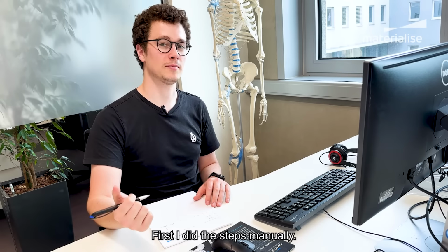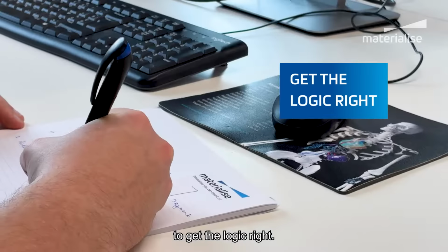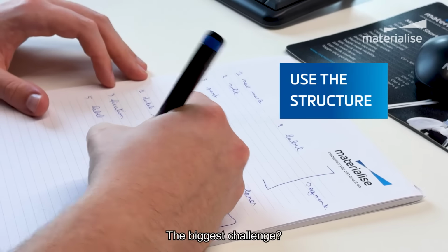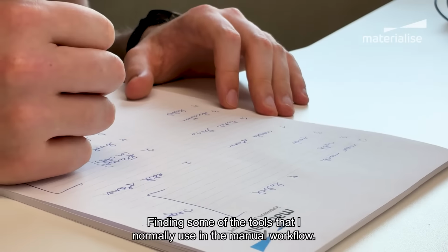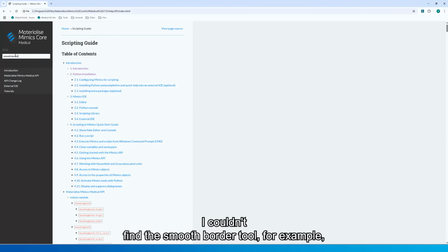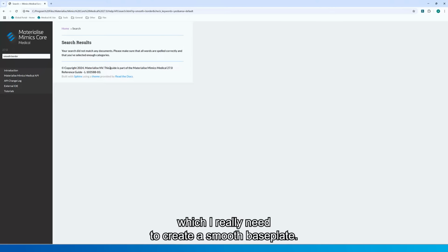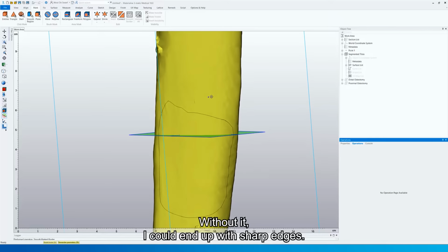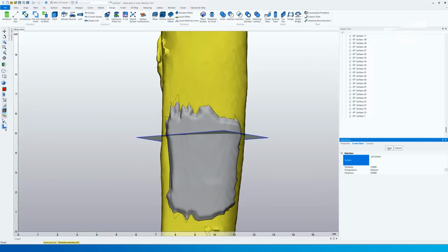First, I did the steps manually, to get the logic right. Then, I used those steps as a structure for my script. The biggest challenge? Finding some of the tools that I normally use in the manual workflow. I couldn't find a smooth border tool, for example, which I really need to create a smooth base plate. Without it, I could end up with sharp edges.